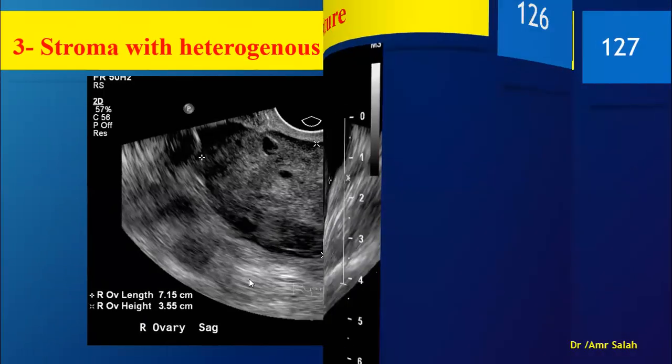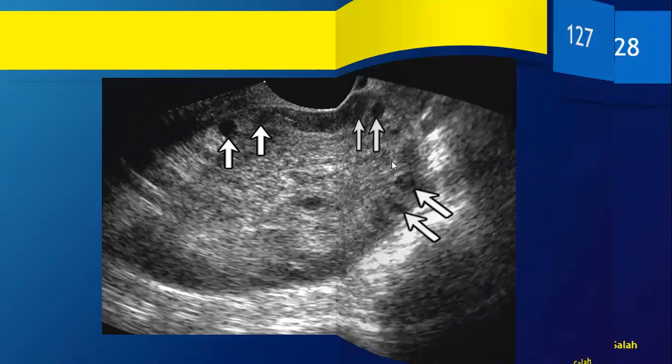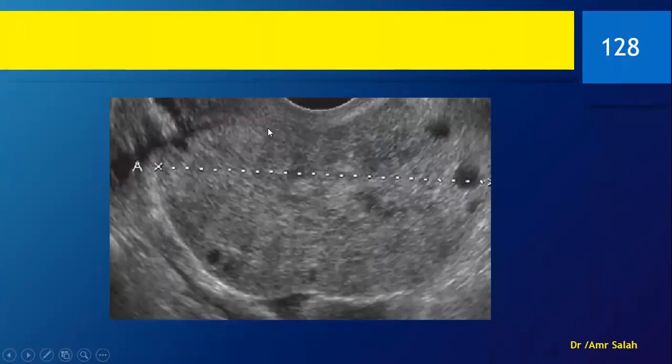All right. You might see a cyst as well. Look at this. The follicles are pushed to the side, and it has heterogeneous architecture here. Of course, this is not PCO because the two clinical settings are very, very different. This is a patient that's having pain, and perhaps she's having tenderness by the probe as well. So this is not the scenario of PCO. This is the enlarged ovary with the heterogeneous stroma. The follicles are pushed to the side.